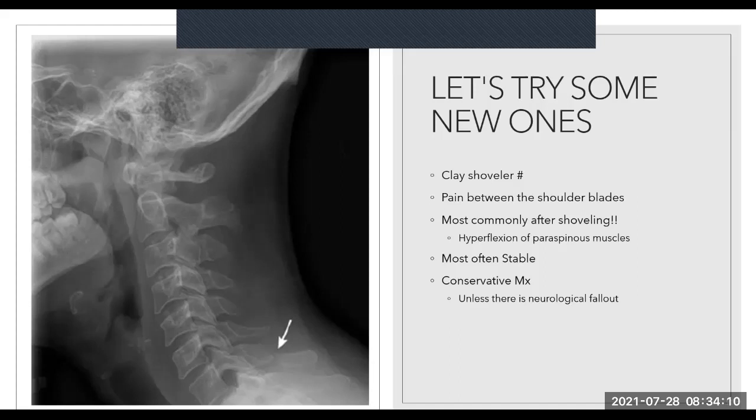When we talk about lines, what we mean is that it has an anterior line, which follows along the anterior border. Then the middle line, which is just the posterior vertebral body. And then the third line is basically this confluence of the spinous processes. So you make sure that those are also in line as well. The most important one is the middle line. The reason being that if the middle line is intact, then at least your spine is sort of saved. The anterior line is next important, and then the posterior line is the least important, but you still have to look at it.